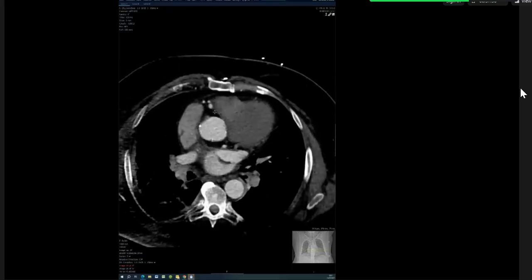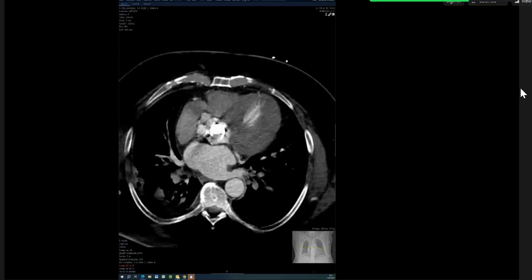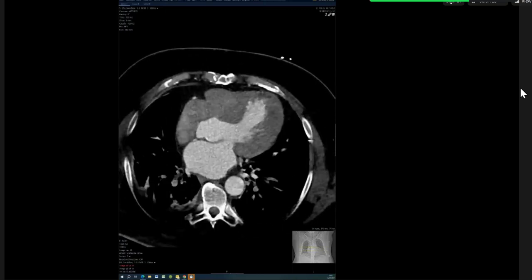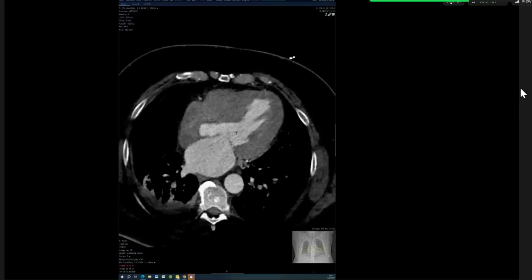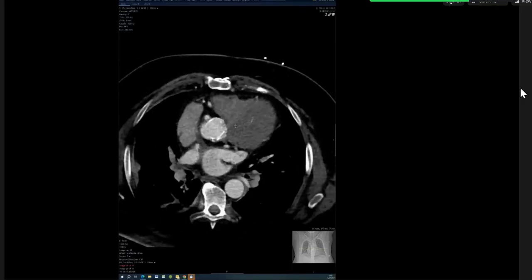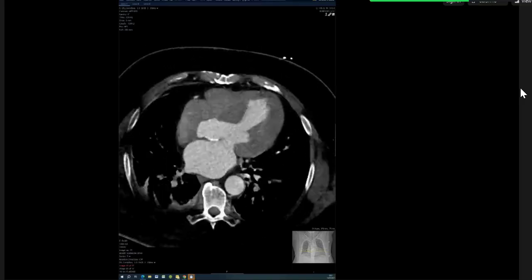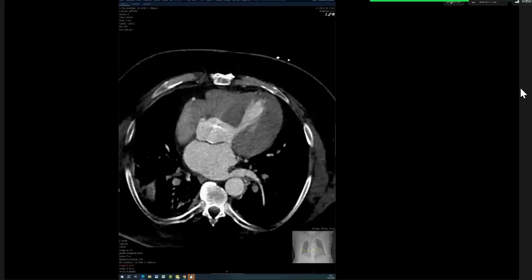Given the patient's previous history, I want you to think out loud, this may represent normal post-operative appearance. I would be interested in looking at the patient's previous history. Given the patient's symptoms and aortic valve replacement, I would consider asking the cardiologist to do an echo to look at possible aneurysmal dilatation of the aortic sinus.